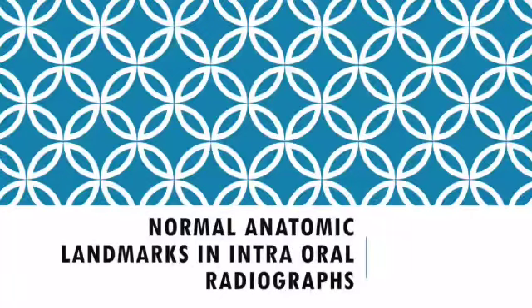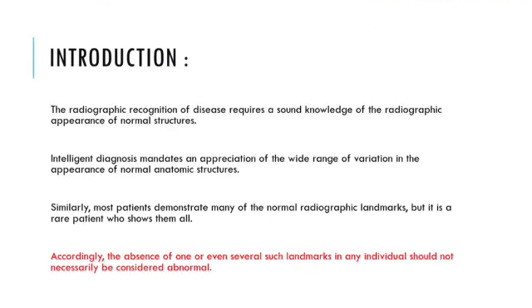So this video is on normal anatomic landmarks in intraoral radiographs. The radiographic recognition of disease requires a sound knowledge of the radiographic appearance of normal structures. Intelligent diagnosis mandates an appreciation of the wide range of variation in the appearance of normal anatomical structures.